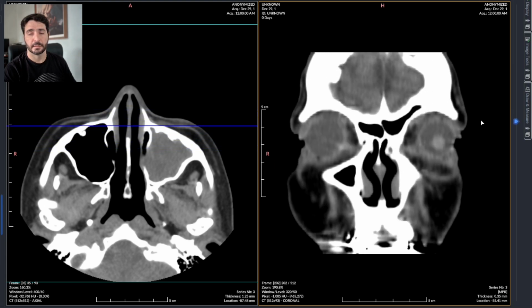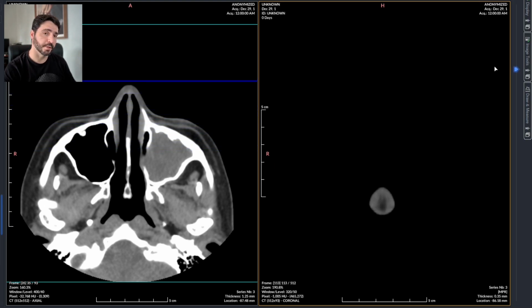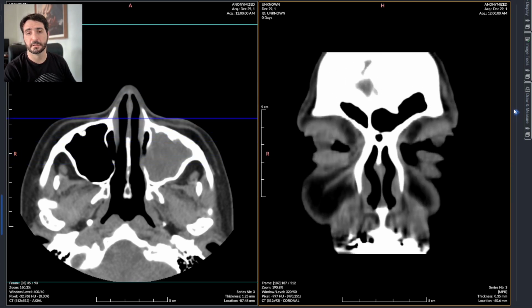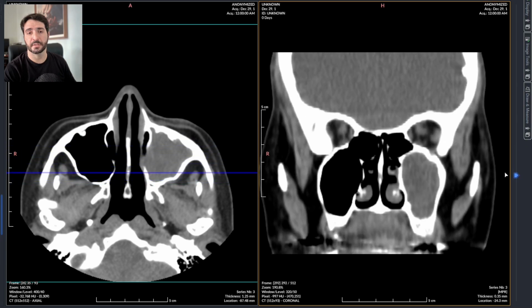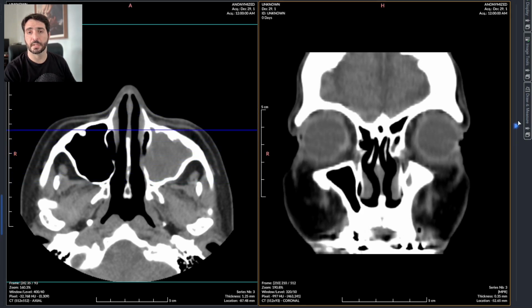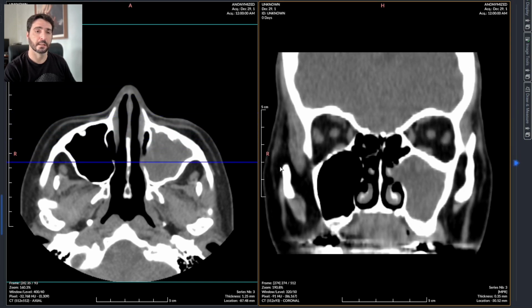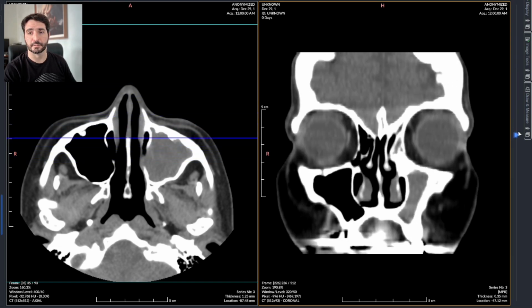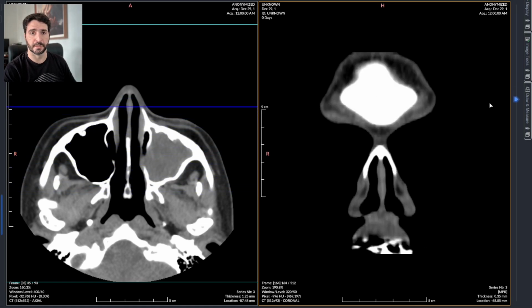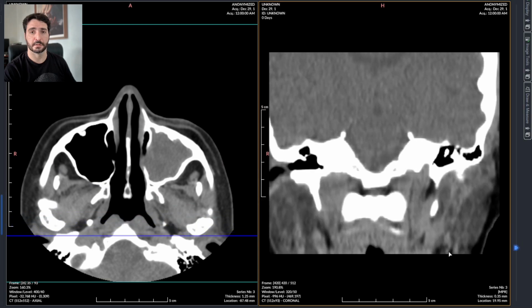This tells us, yes, the patient actually had a bunch of implants to the teeth, at least the upper teeth, maybe both. The sinus acquisition didn't get all the way to the bottom of the face, to the entirety of the mandible. So this is all what we have.